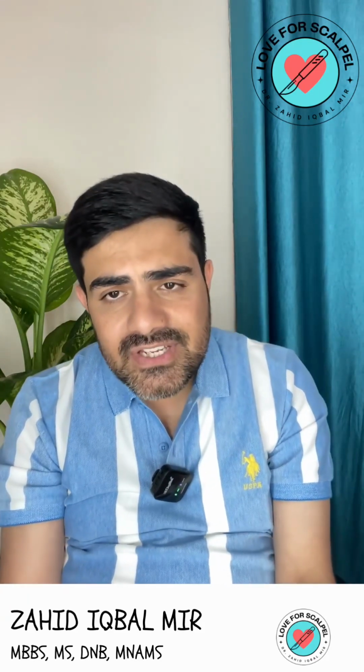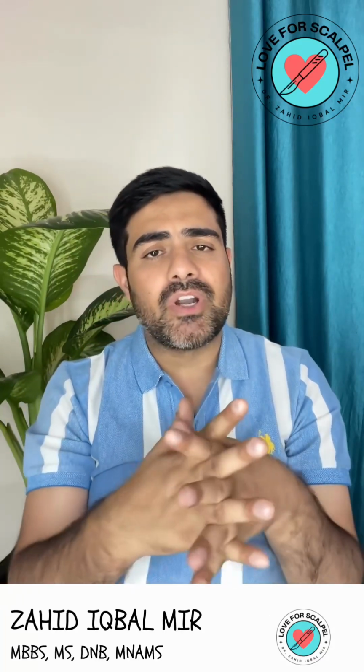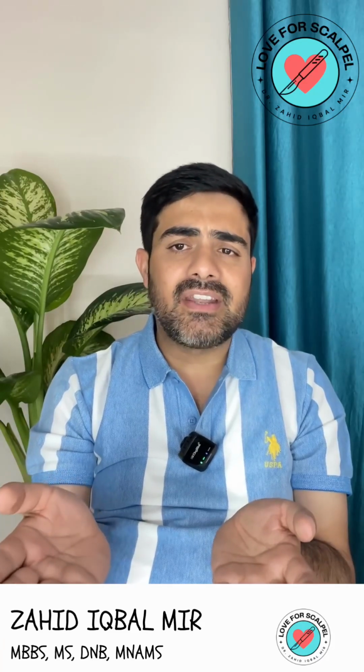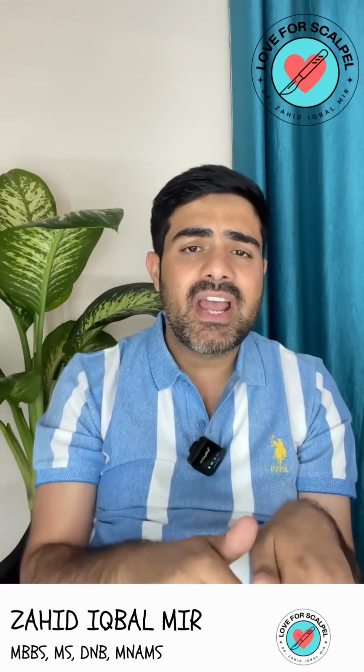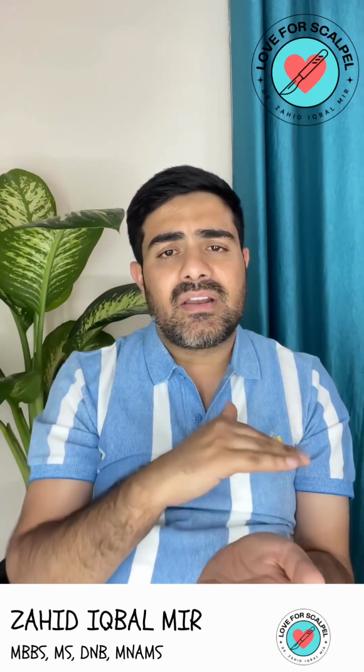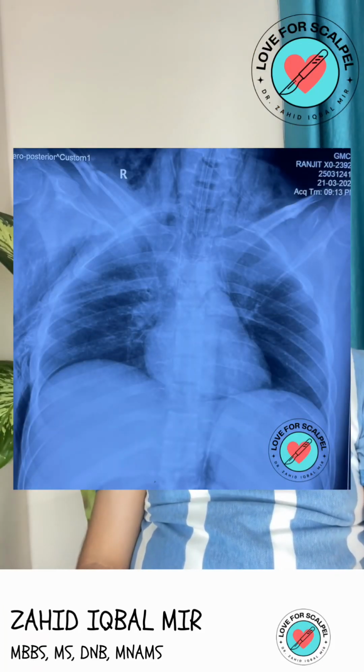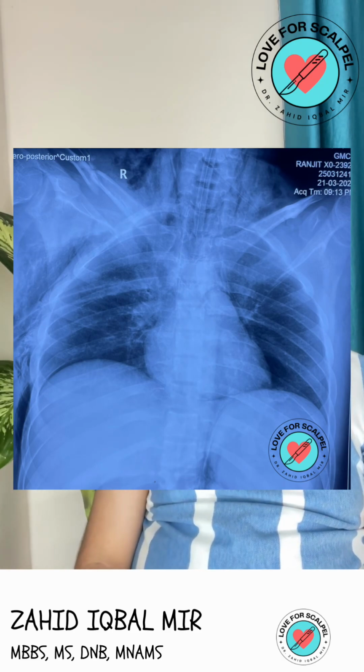Now what is the triangle of safety? Triangle of safety is the triangle which is bounded posteriorly by the latissimus dorsi, anteriorly by the lateral border of pectoralis major, and then there is a line passing through the nipple. So now the fifth question is what can you appreciate in this X-ray 2?